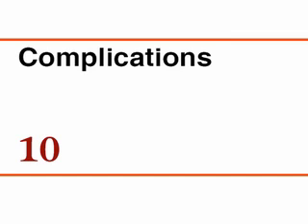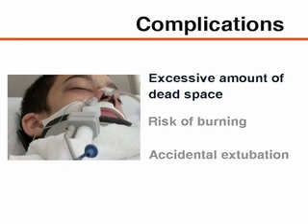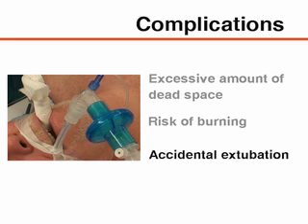Complications. Although capnography is generally safe, its use still carries a small risk of adverse events. Mainstream analyzers may introduce an excessive amount of dead space into the ventilator circuit. Older generation mainstream sensors use heat to inhibit the condensation of water vapor and prevent falsely high carbon dioxide readings, but this increases the risk of burning the patient's skin. Also, to reduce the risk of accidental extubation, caution must be taken to minimize the amount of additional weight placed on the airway.